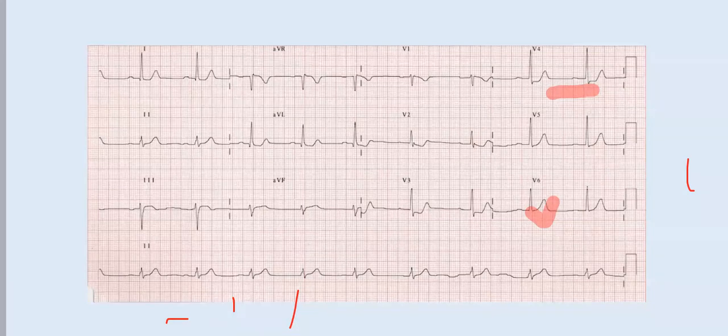And this one is a bit difficult, by the way. يعني تعاين للاي سي جي it does not strike you as abnormal, but on further look, think twice. What do you think about V2? V2. Yeah, it's slightly ST depressed. Exactly. Is it true posterior MI? Yes. This is the problem with posterior.